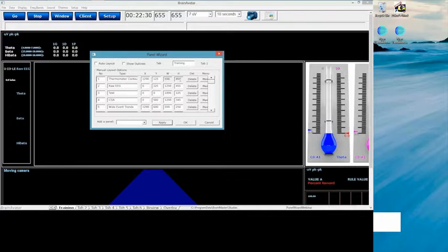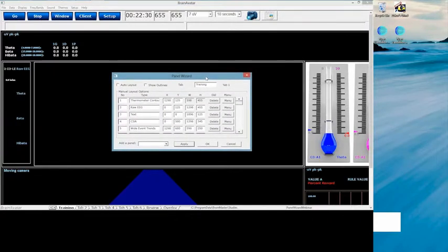They are their size, and even if you do things special, as I'm going to show you here in a little bit, it's not going to actually change the height at all. There are also other options that you have in this screen. One of them is the ability to delete, and another one is to get into that panels menu. I'm not going to cover the panel menu as much right now. I'm going to go more into designing right now, and I'm going to more go into making this screen right here fit my 1600 by 900 resolution.